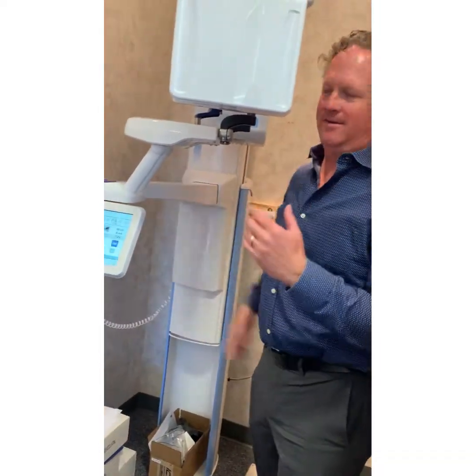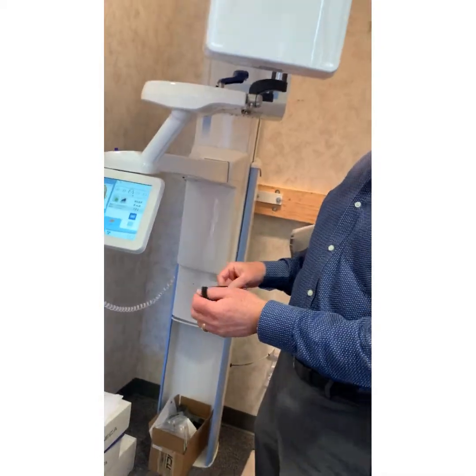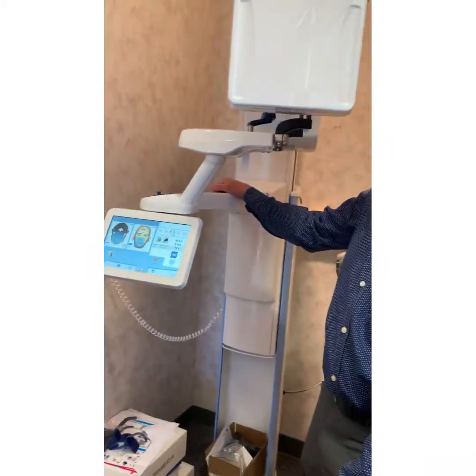It will find it. It'll home and find where it already needs to be. You already broke the new toy. Yeah, typical. These are way more resilient than they used to be. Next time, okay, next time we're just giving them the box.